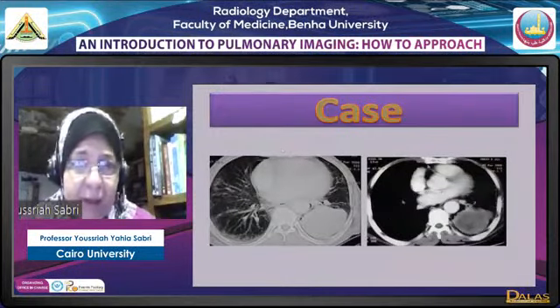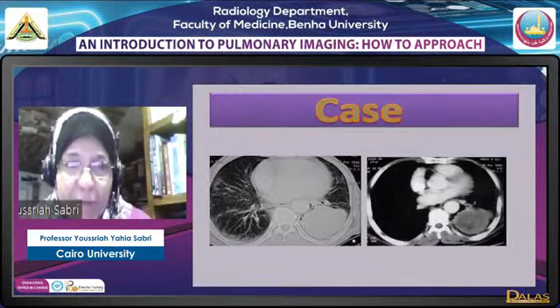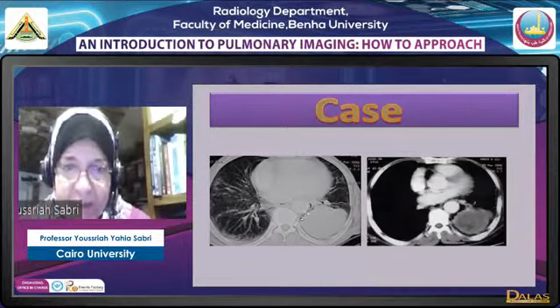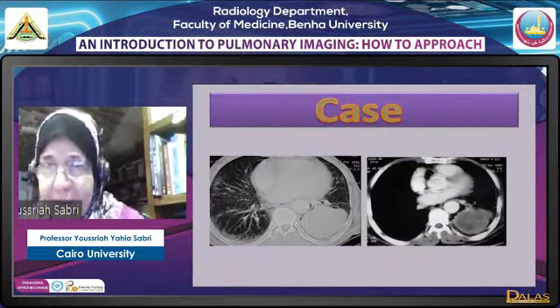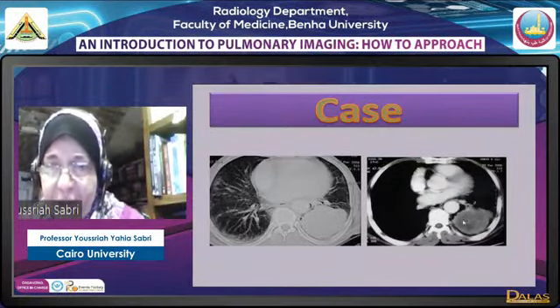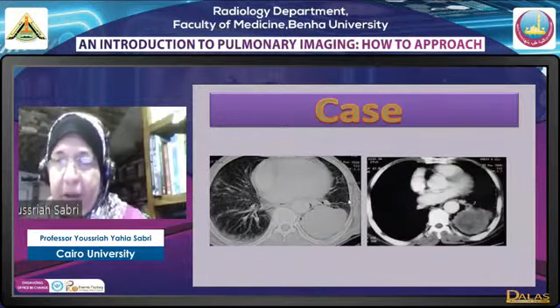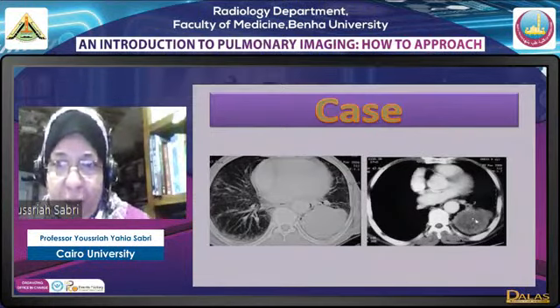طيب another case هنا برضو we have a 65-year-old male smoker، interstitial fibrosis وعندي a rounded lesion opacity اهي. This is a mass with partially well definition, partial lobulation. لما نيجي بقى tissue characterization هلاقي ان ده CT with contrast، في heterogeneous enhancement تمام، وفي هنا prominent extra pleural space دي sign that may suggest malignancy. Again ده male patient 60 smoker هفكر على طول ده وماس bronchogenic carcinoma is to be considered.